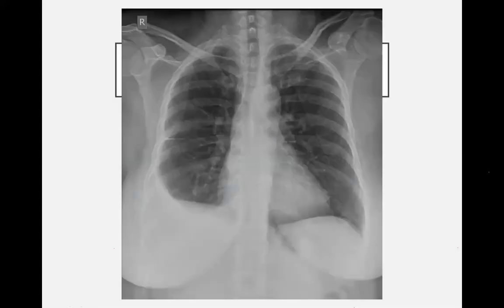Then this is another typical X-ray. So can someone describe this? Sure. Is it okay? Me? Yeah, go for it. Okay. In English, though, is that okay? Yeah, absolutely fine.